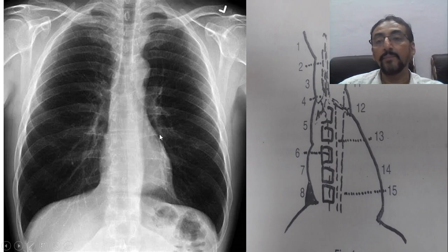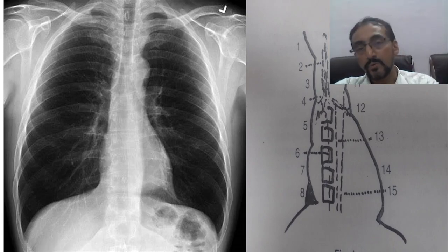And this is the area. What is this area? इतना जो एरिया है, starting from this. So this is left ventricle. Okay, so this is the area of a left ventricle. So area number 15 is the last. यहाँ पे वापस जो लाइन्स आएगा, कौन सा लाइन है? Para-aortic interface. लास्ट लाइन में कौन सा है? 15 Para-aortic interface. Okay, so these are the two important pictures that you have to remember.